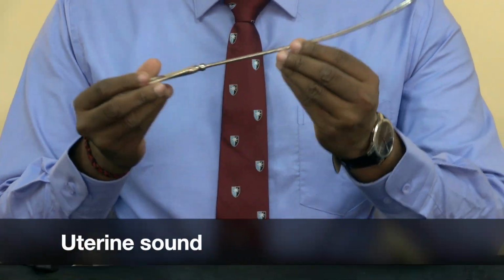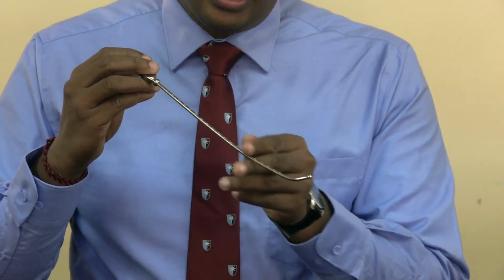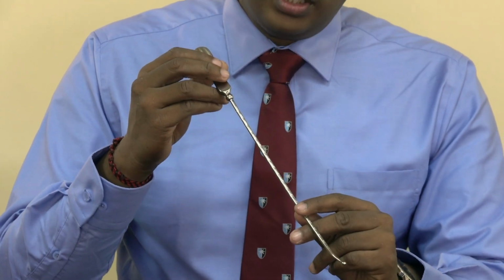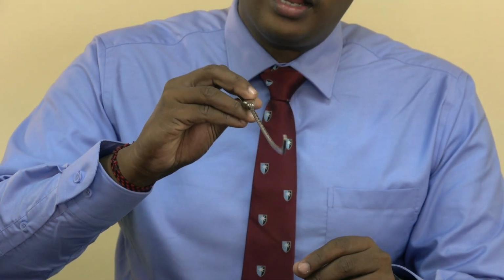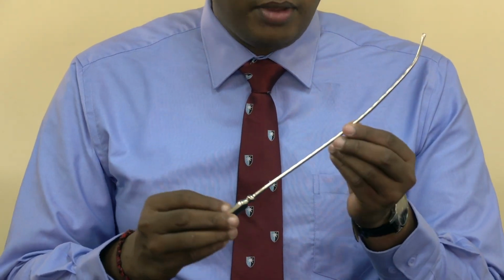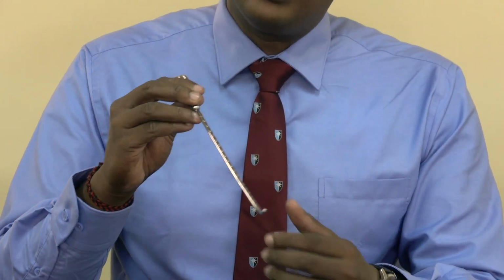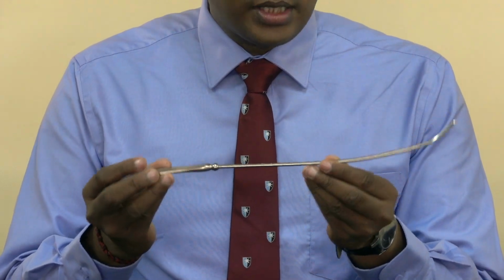This is called the uterine sound. It has a handle and a long shaft, and it is bent at the end. It is usually put through the cervical os into the cervical canal and the uterine cavity to see the uterine cavity length. We can measure, as there are measurements on it, and we can orient the uterus, whether it is anteverted or retroverted. This is called the uterine sound.